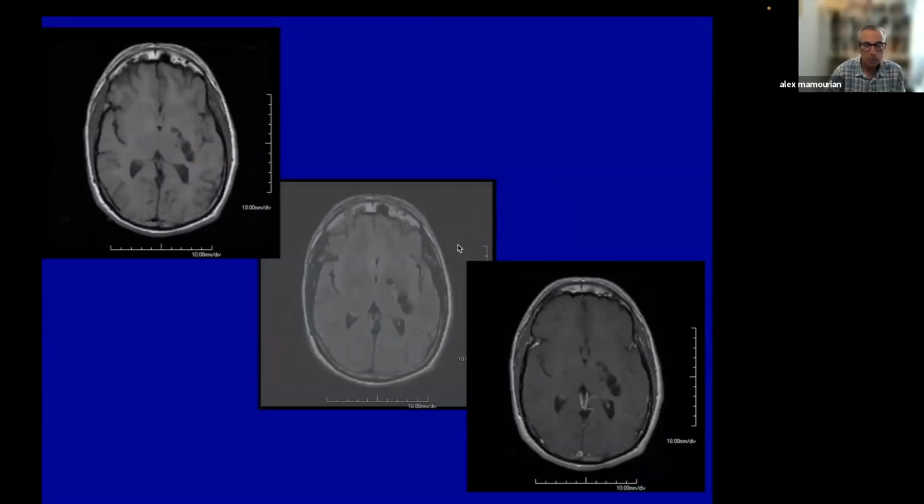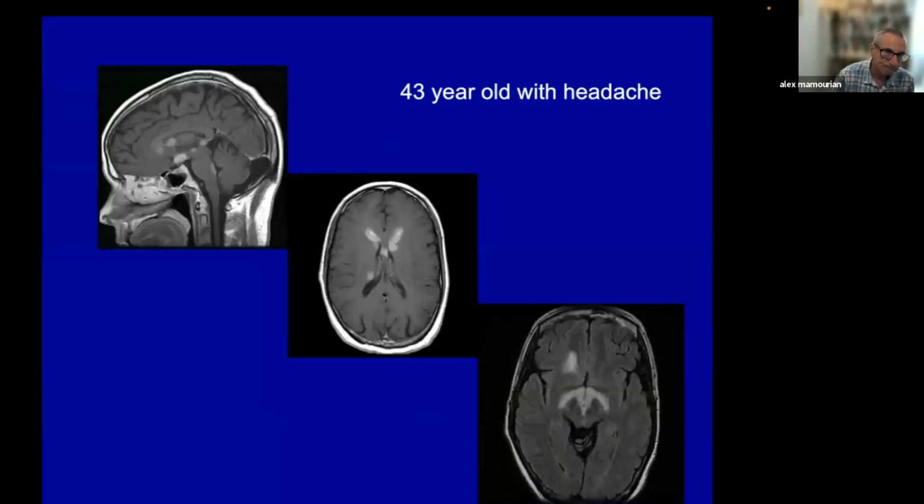Now, these perivascular spaces can become tumefactive, that is, they resemble tumors. Here you can see multiple lesions snaking out along the posterior limb of the internal capsule, with a little bit of T2 prolongation peripherally. There's no enhancement. So these are tumefactive perivascular spaces, which usually only require follow-up imaging. No treatment is necessary, though in some cases they may cause some mass effect. I know one patient we had had these in the midbrain and required shunting, but they don't require any treatment beyond that.